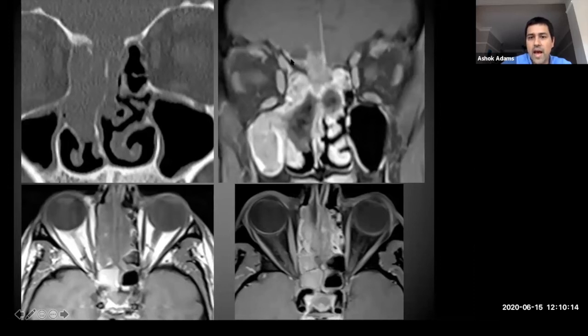This is all abnormal dural enhancement, and that mass has traversed the anterior skull base and gone into the anterior cranial fossa. Now, from a radiologist's point of view, there's a huge list of potential sinonasal masses. I don't try to second-guess the underlying pathology, but your job as a radiologist is to mark out: is there a mass, yes or no?